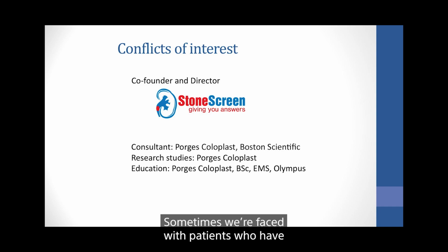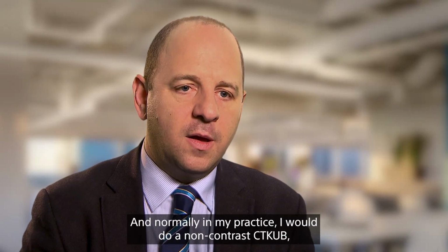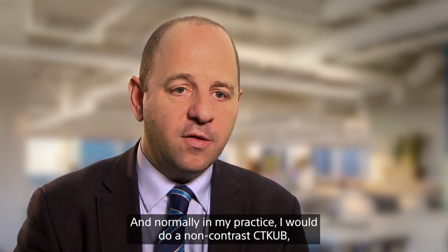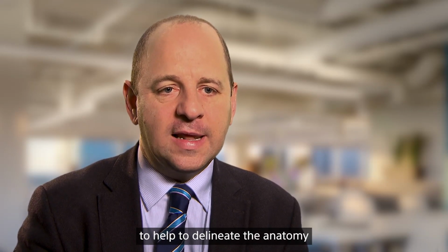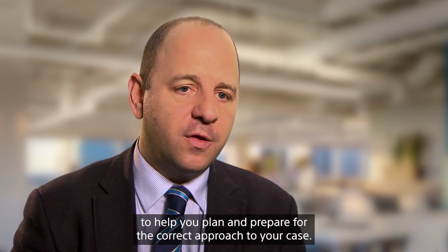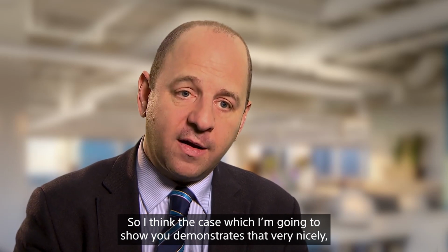Sometimes we're faced with patients who have complex stones or complex anatomy. Normally in my practice, I would do a non-contrast CT KUB. But just sometimes it's very helpful to get a CT scan with contrast to help delineate the anatomy, to help you plan and prepare for the correct approach to your case. So I think the case which I'm going to show you demonstrates that very nicely.